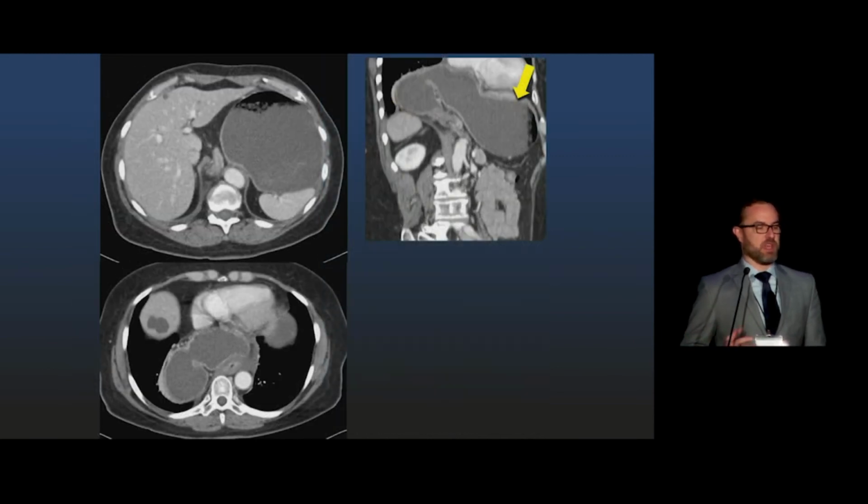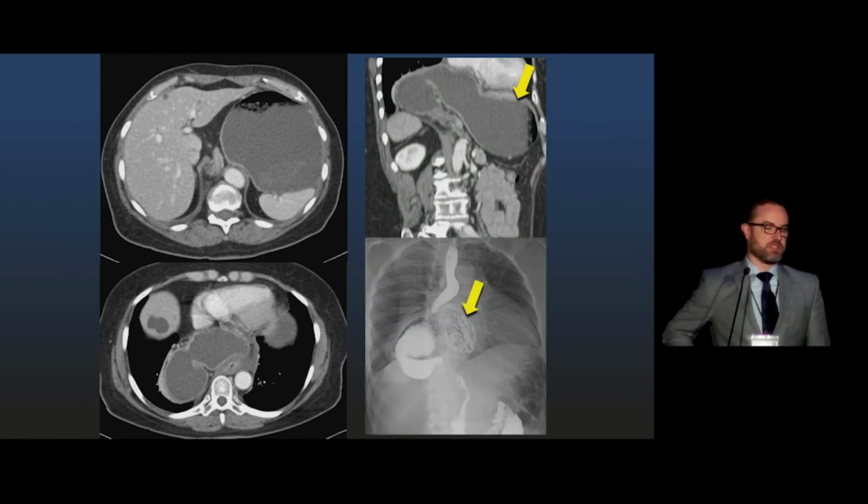Here's the opposite case. This patient came into the ER. They have a large hiatal hernia. Their fundus is below the left hemidiaphragm. We called this gastric volvulus because we were concerned about this transition point near the hernia neck and the gastric distension. This is their upper GI series that occurred 2 days later after their symptoms resolved. So the stomach is back up in the chest. They are no longer vomiting. They are no longer in extremis. And so this is a dynamic process that sometimes can be tricky when you only get one snapshot in time.